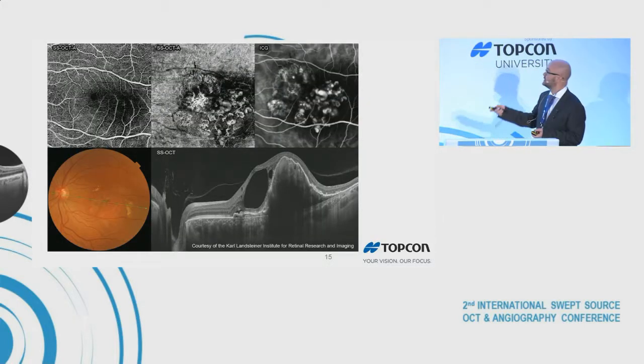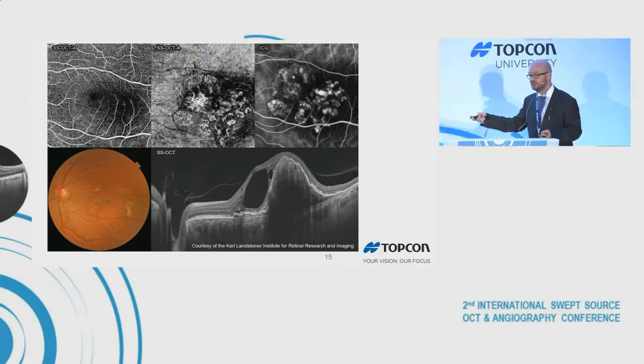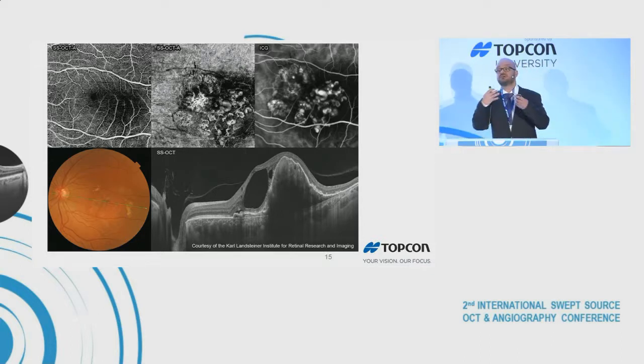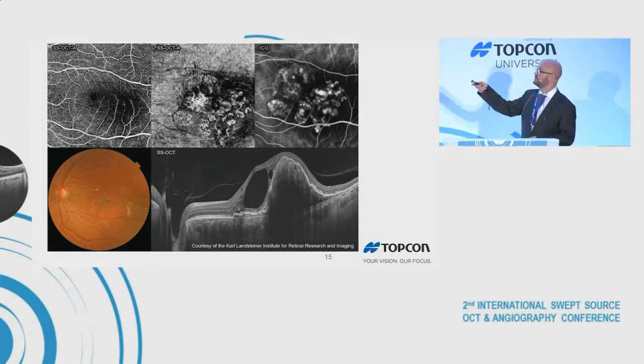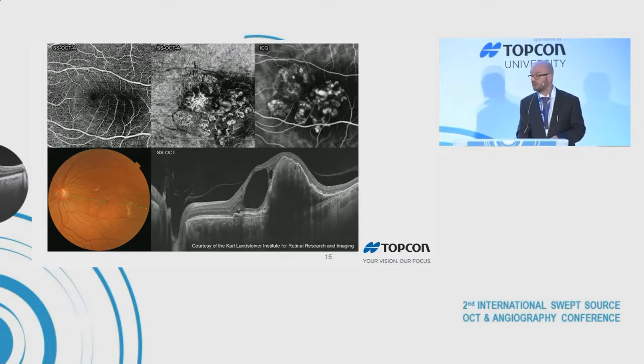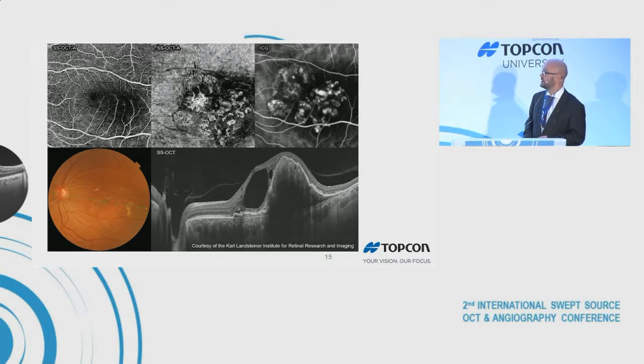So in this patient, here you have the ICG, and here you have the OCT-A that's been resegmented, and you can see every single one of these polyps is represented in the OCT-A because of the penetration through the RPE. And that's why we're able to visualize this in a way that hasn't been really very well possible up till now.